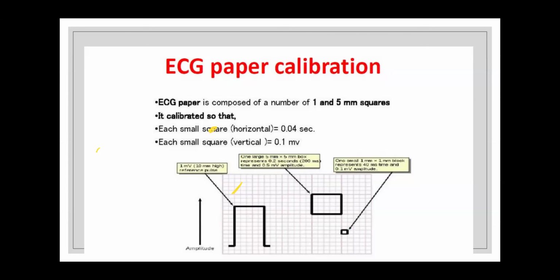So how are you going to read those ECGs? For example, an ECG has an x-axis, and it has a y-axis as well. At the x-axis, the speed is shown.